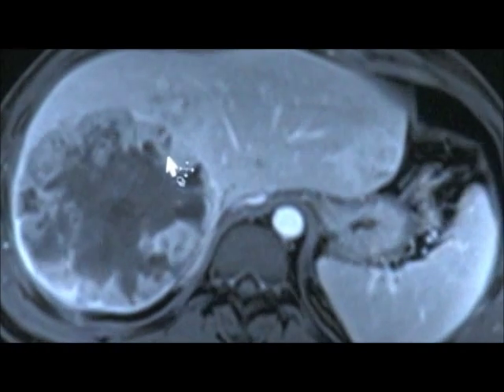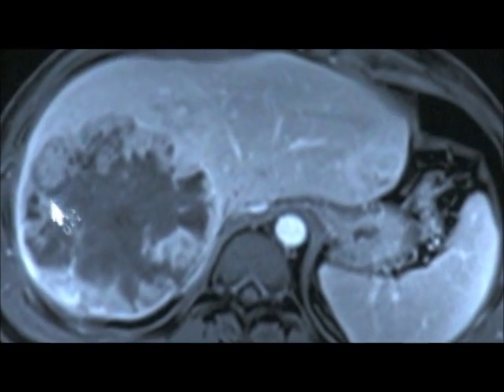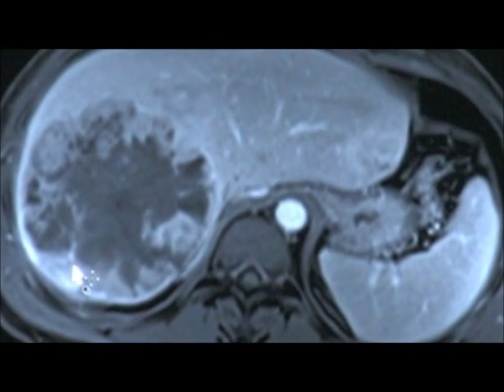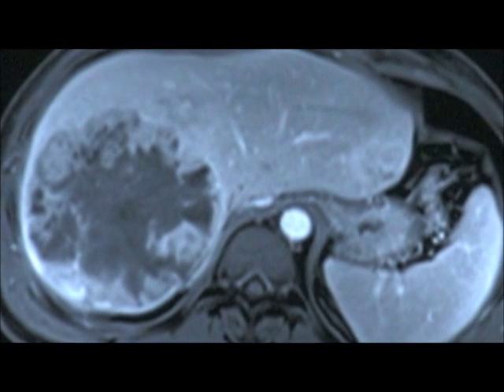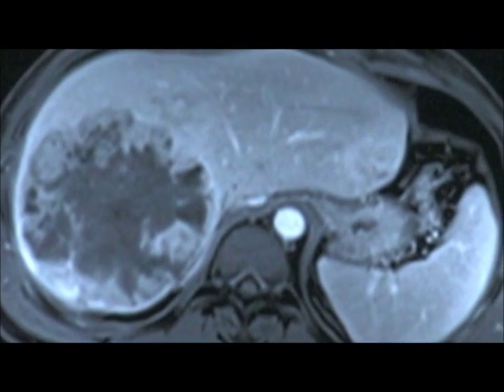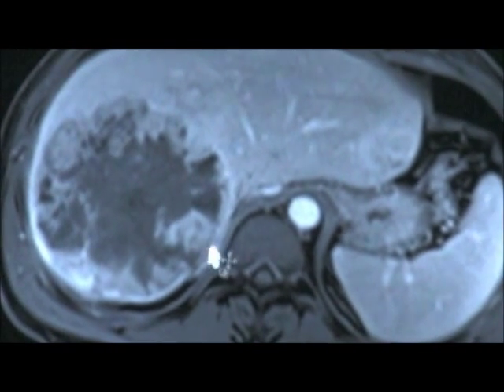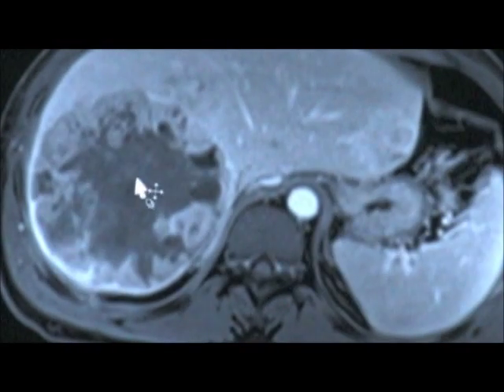And that's going to lead to what I suggested the diagnosis was, and then we found out subsequently that in fact I was correct. And it's something that we're currently working on, so it's a very unusual case. And here we can see that the masses of tumor show peripheral enhancement. Centrally where we saw the blood, it's not enhancing, so we call that central necrosis.